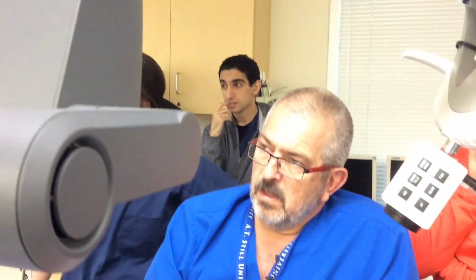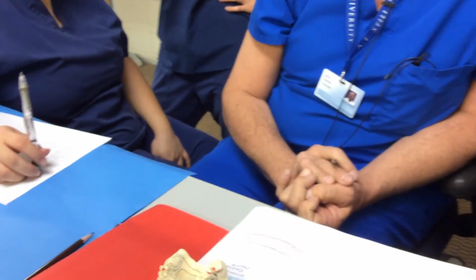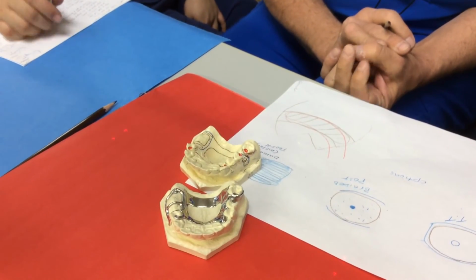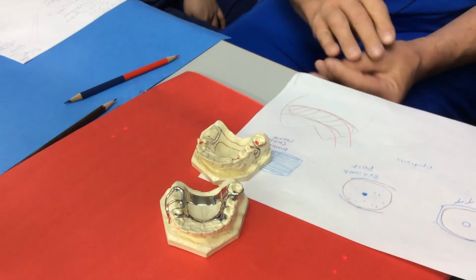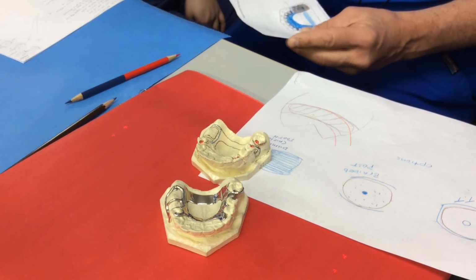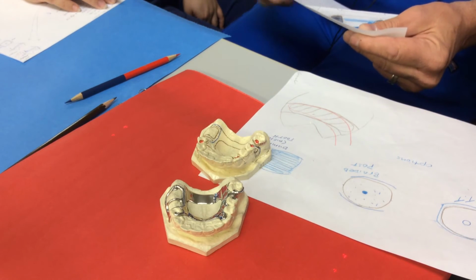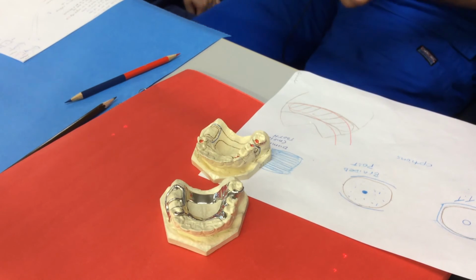Yes. So when you're marking on the design sheet, how do you write? When you're working on the design sheet, here, how do I mark the... Cover that. He's just using it to show. Oh, I think that was wrong on the first one. Oh, that's all right, I'm looking at it to see what she's talking about. How do I mark what?